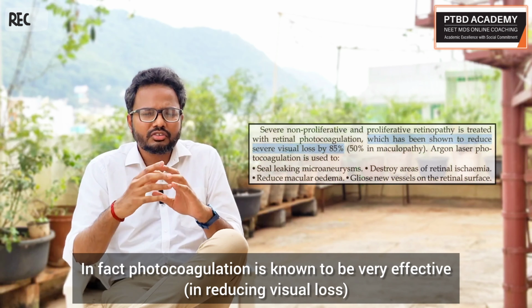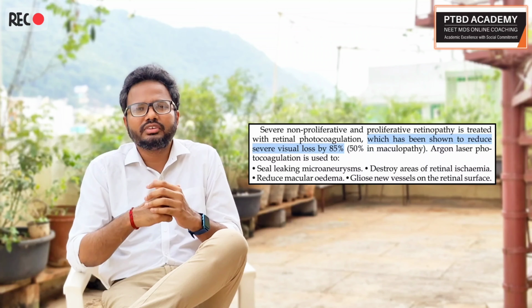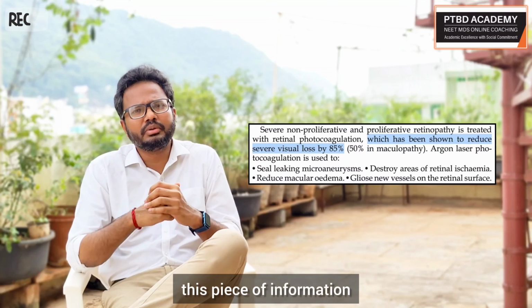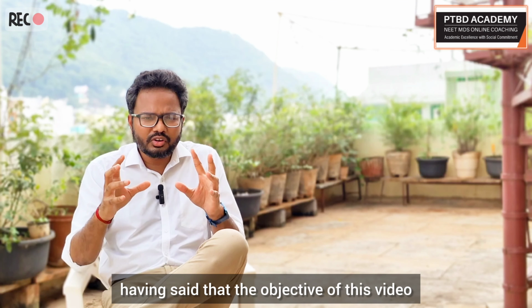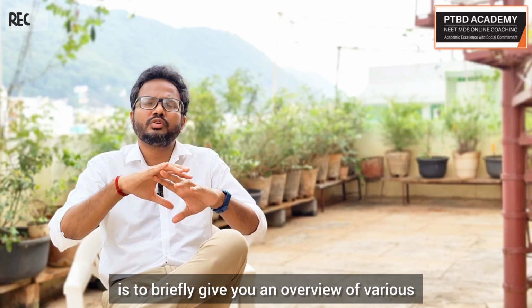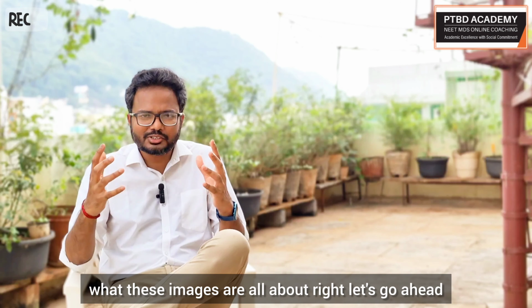In fact, photocoagulation is known to be very effective, as you can see here, picked from Davidson. So having said that, the objective of this video is to briefly give you an overview of various dimensions of diabetic retinopathy. Now let's get into the core where we'll project images and simultaneously discuss what these images are all about, right? Let's go ahead.